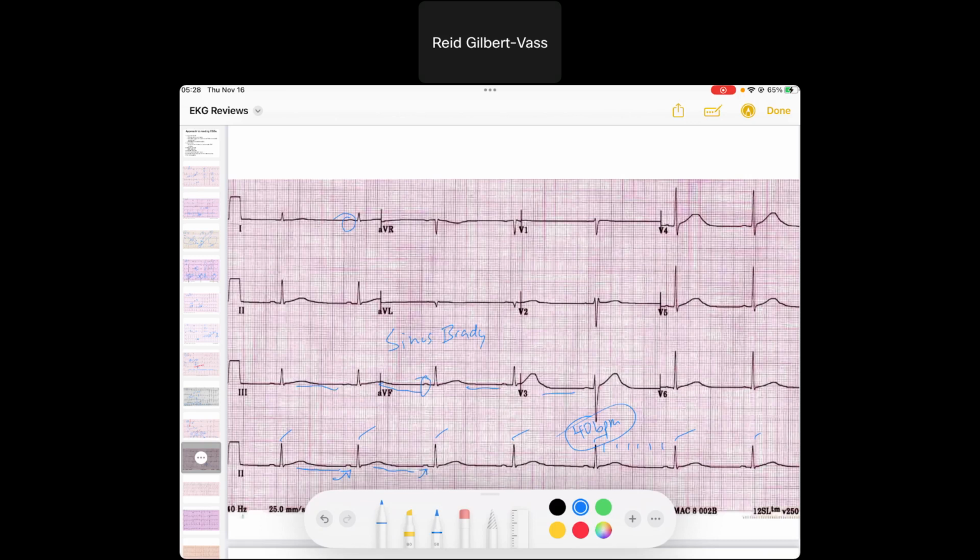And so in this patient, I would continue to see the PR interval looks good. They've got narrow QRSs that are up in 1 and up in aVF. And so we know the axis is somewhere down to the left, which is between 0 and positive 90 degrees, which is normal. I've got normal R wave progression throughout the precordium. And so I would say my QT interval is getting closer to being on the longer end, and you can calculate that if you would like. This is a good example of sinus bradycardia.